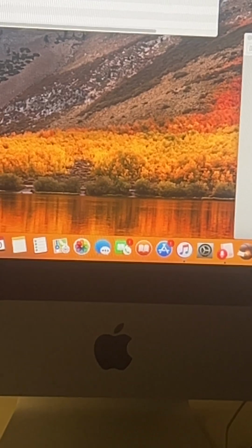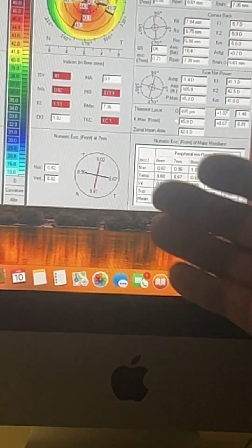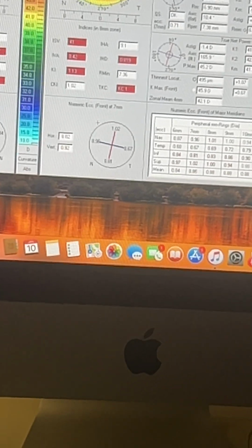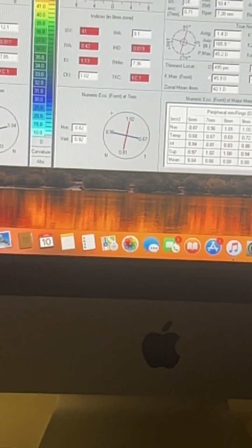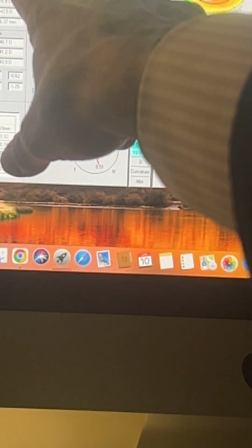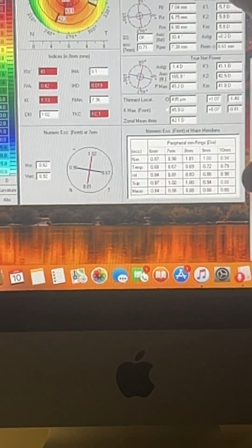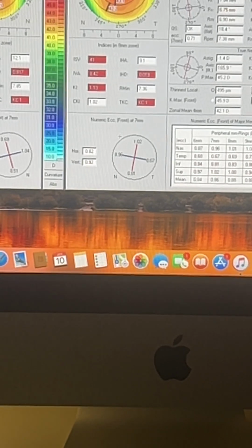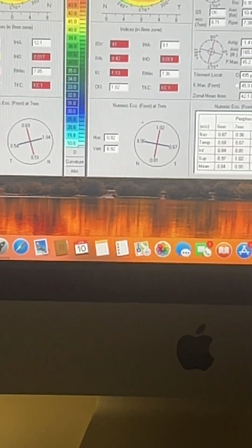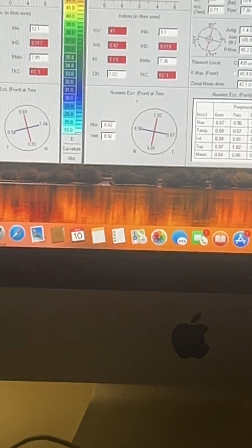Of course, the task remains: what do you do for laser vision correction? A 50-year-old lady that has a cornea like this and has a hyperopic prescription of +2. The average keratometry here is almost 42 diopters on the right eye, 42.5 on the left. Again, it suggests that these are hyperopic eyes with relatively steep corneas though, so probably much shorter than average than what their hyperopia reveals.